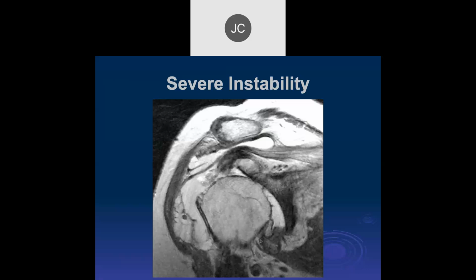For some reason, they thought this patient had severe instability clinically. I don't know why, John. I think they could be right. It looks like there's a full thickness tear of the supraspinatus, and I'm looking at a chronically torn inferior glenohumeral ligament that's calcified or ossified, and marked deformity of the glenoid here, and severe muscle atrophy.